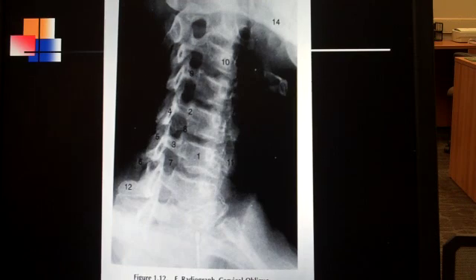As we get started with these, number one is on the vertebral body, and so all of this, of course, is the vertebral body. Number two is labeling the transverse process, which is coming across right here. Remember that it is a trough-like shape, and so you're sort of looking at this one on end, and that is the transverse process. Number three, which is right here, and if I went to this segment, would be right here. And so we have the TP and the pedicle. Number three is labeling the pedicle.